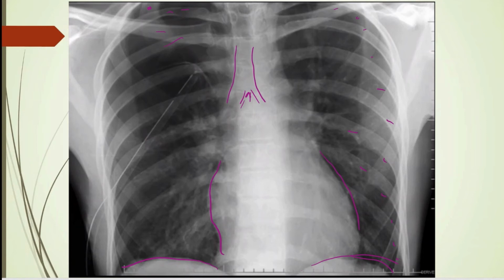But you look here on the right lung, right off the bat you can see a chest tube. So here's a chest tube. And up here you can see a lack of vascular lung markings. Look how you don't see any lung markings up here. Yet down here you see the vascular lung markings pretty well. So you can see this patient still has a pneumothorax even though they have a chest tube in. You can see the pleura right here.